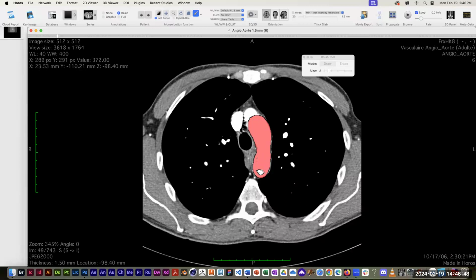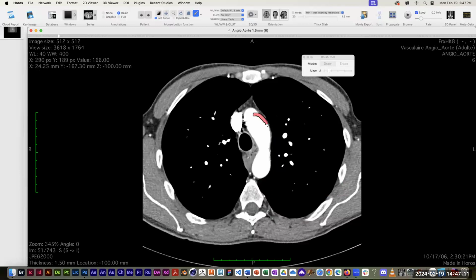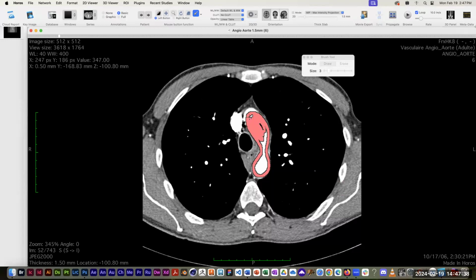We're getting closer. You can see the aortic arch is starting to pinch in a little bit in the middle, almost like a sort of figure eight shape. So the ascending and descending are starting to separate from one another. Just another couple minutes, and then I'll be able to show you the next steps in the process. Just about separated here.